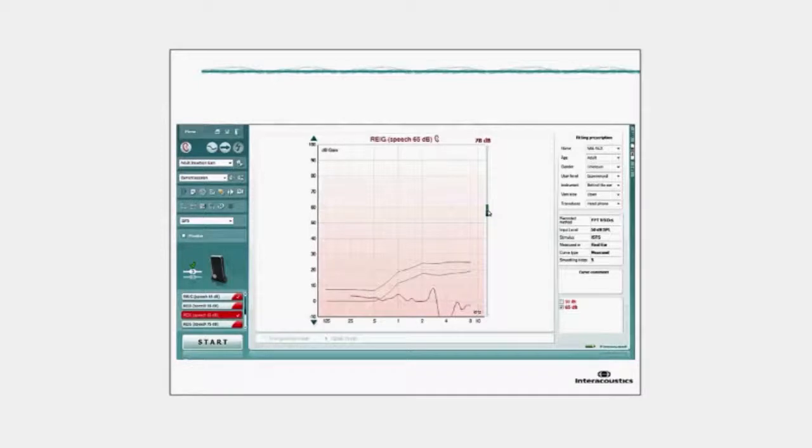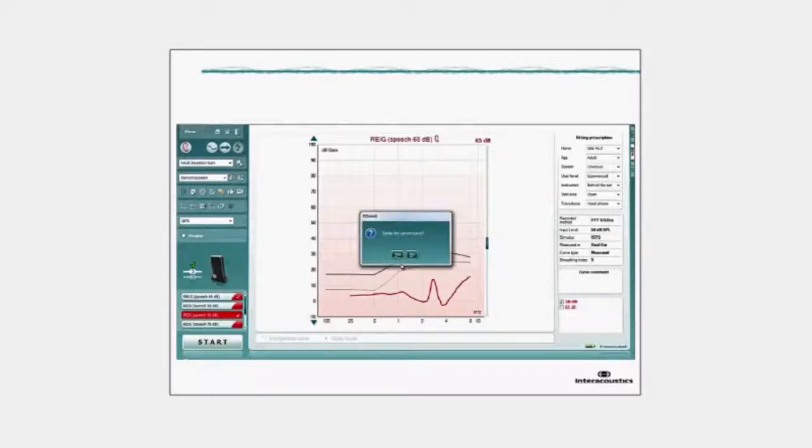And again, increasing and decreasing the target will allow you to see the different ones. Re-enabling them brings back in the target and the measurement together. On deleting them, it will delete now both the target and the measurement, whereas in the past it would only delete the measurement and leave the target on the screen, therefore cluttering the screen.